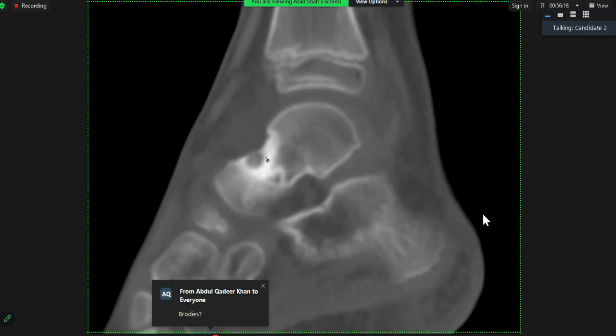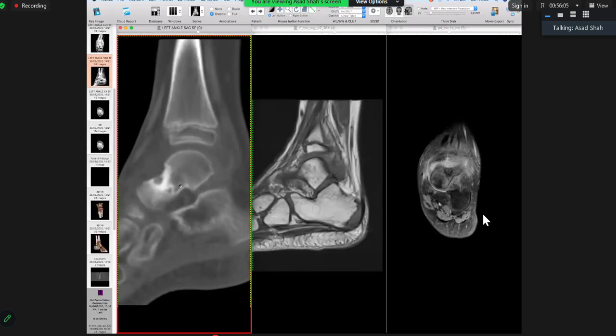Osteoblastoma is more than, and osteoid osteoma is less than, 1 to 2 centimeters. If it is more than 2 centimeters, it's osteoblastoma. It's the size, isn't it? So if the lesion is small, it's called this. This is a typical morphology of osteoid osteoma, right? And this is what we call a subarticular one, okay?